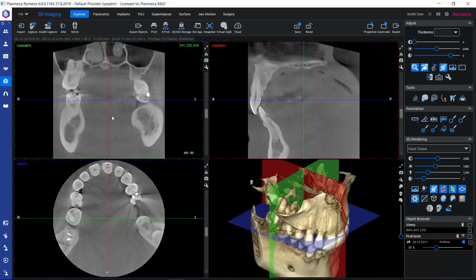We also have these other image processing algorithms available here. So we could also apply the artifact removal algorithm, Planmeca ARA, or if we would also have the CALM algorithm for compensating for patient movement, we could also apply that on the volume afterwards. So for these adjustments, we would need to be on the image capturing workstation in order to have access to the raw data. When using our 3D imaging units, our reconstruction PC stores the raw data of the last 100 images.